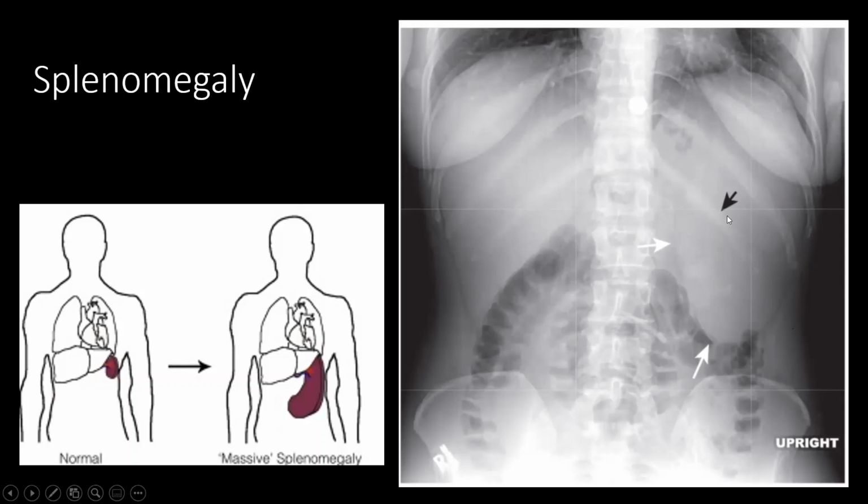When I have this normal spleen, it should be like this. Here, it should be the normal shade of the spleen. But this spleen is going past the 12th rib. When I have this shadow going past the 12th rib, and this shadow is going diagonally, not that close to the vertebral column, I will say that this is the shadow of an enlarged spleen. This phrenicocolic ligament prevents the more downward placement of this spleen. That's why it goes and grows diagonally rather than growing vertically downward.